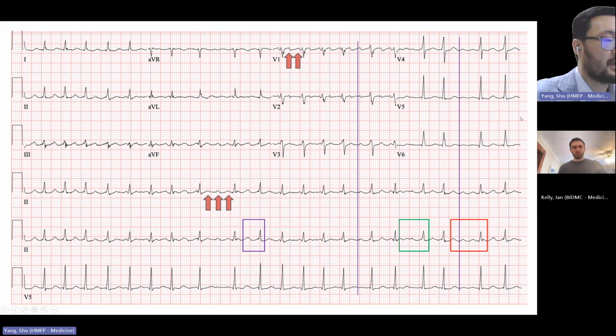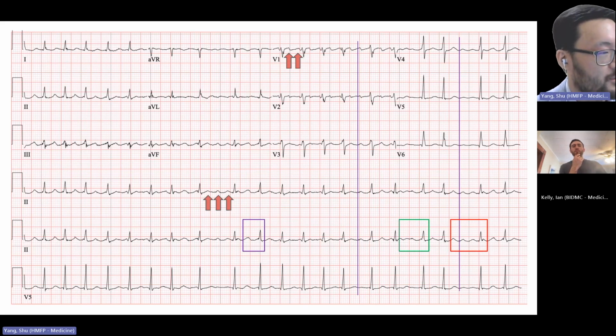So this would be an example where you cannot say, based on the EKG, that this is a typical flutter. What I mean by typical, as we'll get to in a little bit, and we've alluded to before, is that this is not definitely an arrhythmia that is circling around the tricuspid valve that utilizes that cavotricuspid isthmus, that tissue that we can easily ablate and reach from the right side. So when I see this flutter as an EP going to do a procedure, I think, all right, I have to be willing and ready to go transseptal to ablate something that may be in the left atrium, that may be in the septum between the atria. So that's how I view this EKG.